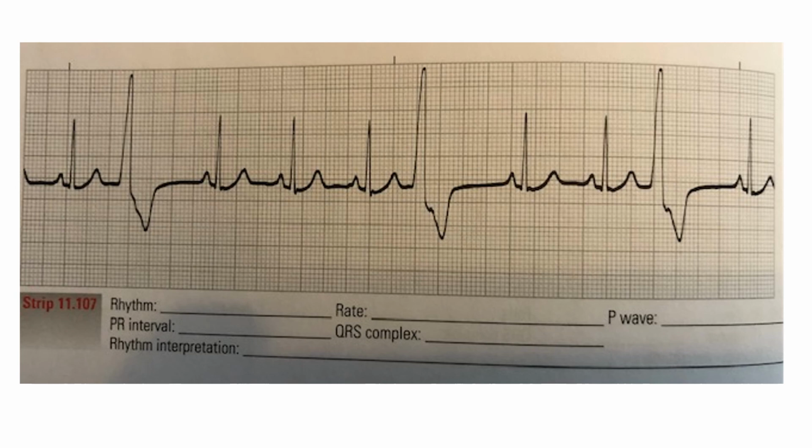So when you have PVCs, more than one, and they look the same, we call them unifocal. If they looked different, so if there were PVCs that were going in the opposite direction of these other ones, then they would be coming from a different spot within the myocardium, the ventricles, so we would call them multifocal, but these are unifocal PVCs.